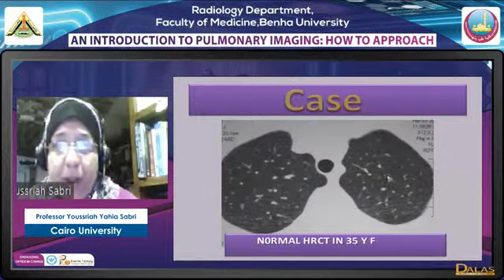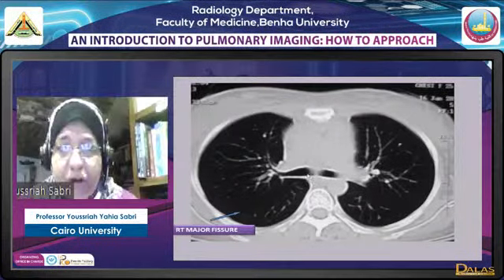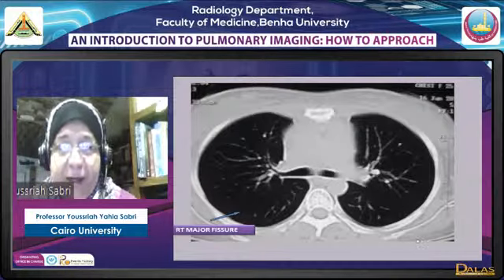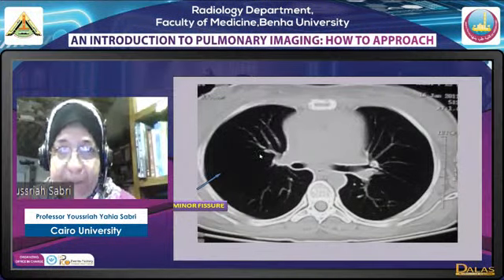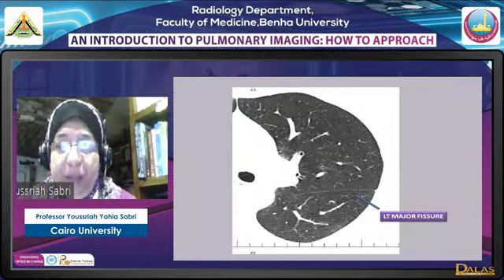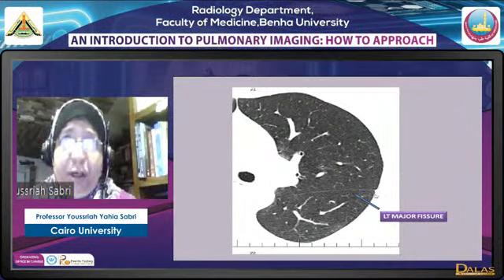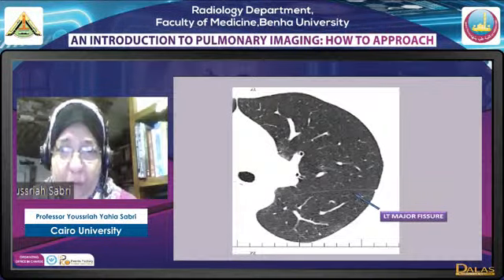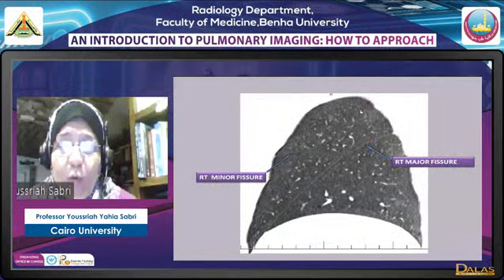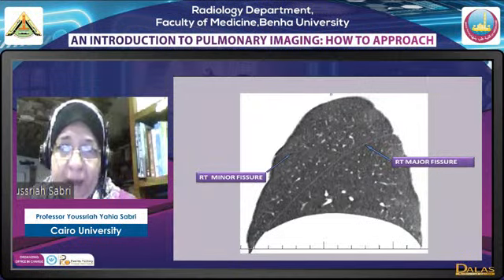This is in the high resolution. Then the fissures are very important. This is a conventional CT study. The major fissure shows as a band of avascularity while the minor fissure will show as an area of avascularity. Whereas in high resolution, where we take very thin sections of less than 2 millimeters, we will see the fissure as a line. If you don't see the fissure, this is not high resolution. Okay? This is high resolution done as a volumetric study. Okay? And so we do reconstruction with the same quality, and we have this the minor fissure and this the major fissure.